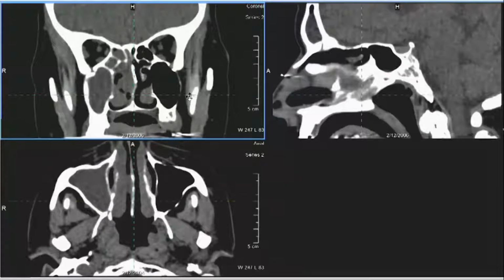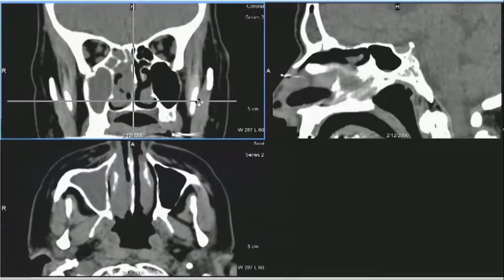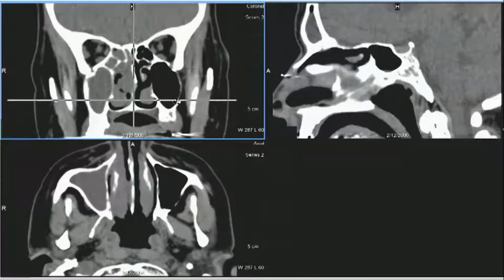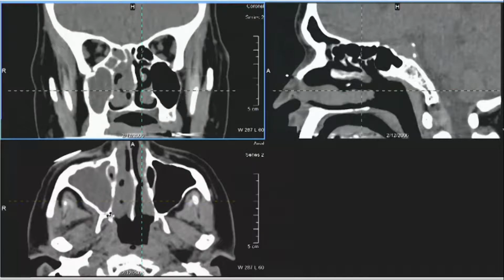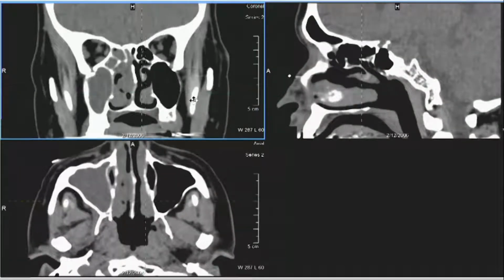The next checkpoint is the fat pad in front of the maxillary sinus, seen here underneath the superficial musculoaponeurotic system. That's clear, the branches of the infraorbital neurovascular bundles being seen, as well as the fat pad posterior to the maxillary sinus, which in this patient is abnormal on this side compared to that, so that there is strong evidence that this disease in the maxillary sinus has filtered through the posterior wall of the maxillary sinus, leaving the bone intact, spreading likely along the posterior superior alveolar vessels.